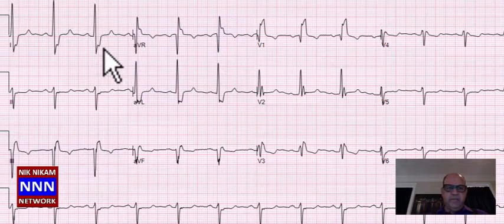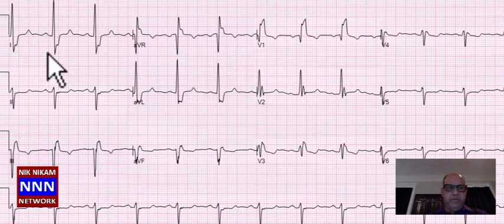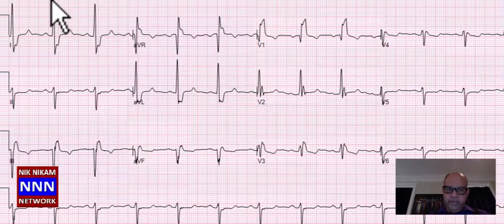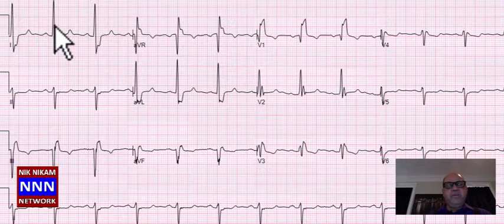Okay, right bundle branch block. I keep repeating this. Just look at lead one beat, and you can tell you what the story is. Here a terminal S wave which is slurred, that is right bundle branch block. There is increased voltage in lead 1 that may suggest some left ventricular hypertrophy problem. We'll come to that later on.